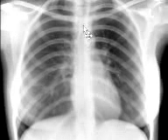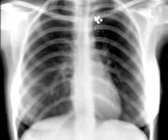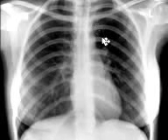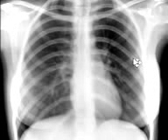As you can see, the medial end of right clavicle, which is visible here, is projecting over the thoracic spine, versus the medial end of left clavicle here is projected away from the thoracic spine. This patient is slightly rotated towards the left hand side, and if patient is rotated either on left side or right side, you may see asymmetry of gray scales.